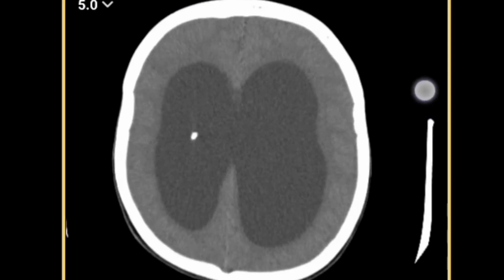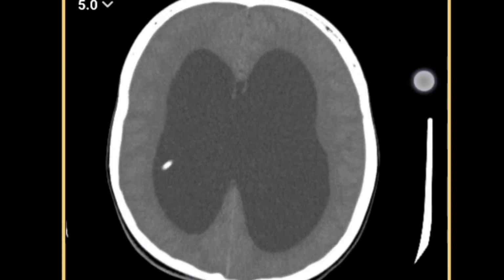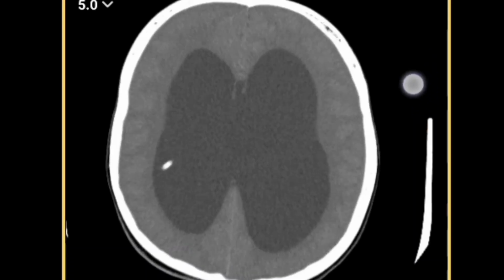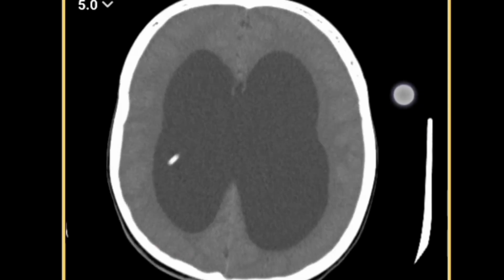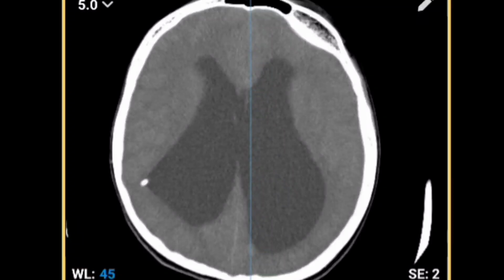Both-sided lateral ventricles are grossly enlarged, and beside this you can also see ventricular shunting. If I go down in view, you can appreciate on both sides the visible caudate nucleus, and the convexities of the frontal horns are preserved.